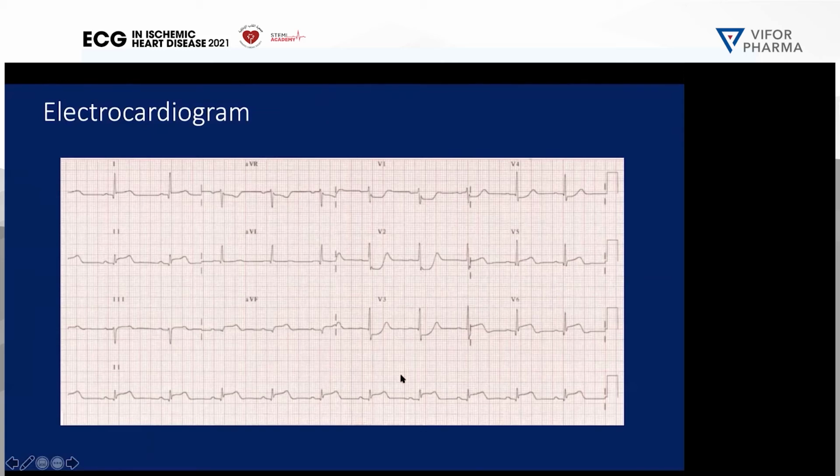The problem will come with the ST segment. In lead 2, lead 3, and AVF it looks elevated. And if you look at the lateral leads, lead 1, AVL, and V6, it is elevated. Then you have ST segment depression from V1 to V3, even to V4. So what does it mean, Dr. Zubaidi? You already explained before. Can you explain for them again?